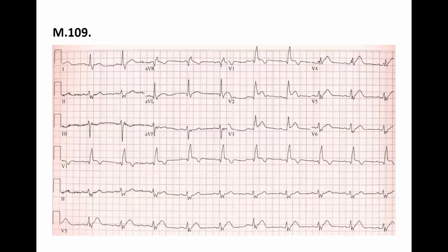It's rhythmic, and it's about 75 beats per minute. Well, a little bit less, so it's okay, about 65. Now lead 2, is it equiphasic?